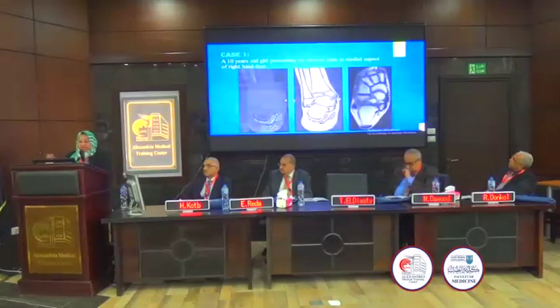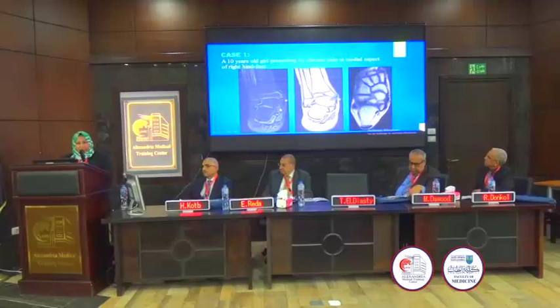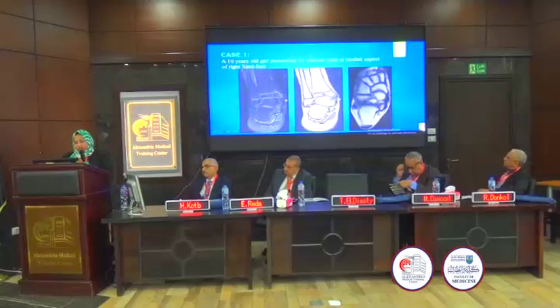I will start with this 10-year-old girl who presented with chronic pain at the medial aspect of the right hindfoot. And we found that there is abnormal configuration at the level of the middle subtalar joint. There is bone marrow edema. So we thought about talocalcaneal coalition, which is common, of course, at this age. But what was abnormal here was that there was an accessory ossicle interposed between the subtalar facet and the sustentaculum tali.